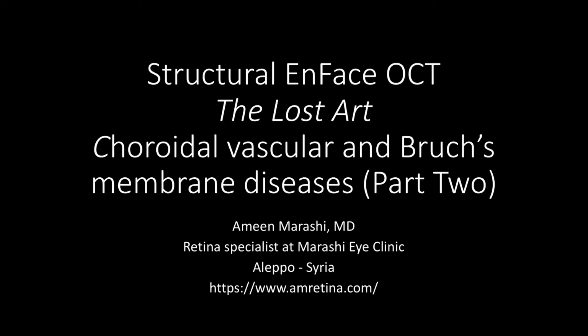I am presenting the course of structural Enface OCT, and in this presentation, I will present the findings of structural Enface OCT in Bruch's membrane choroidal vascular diseases, part 2.